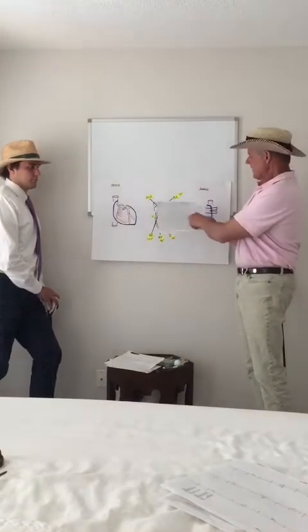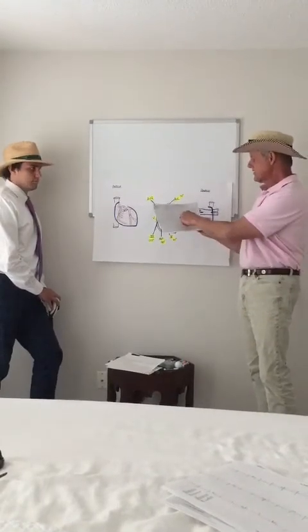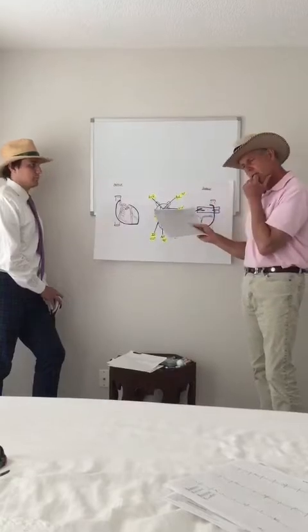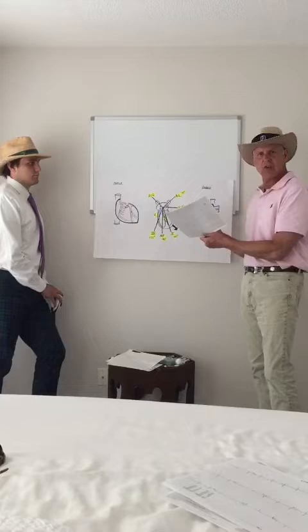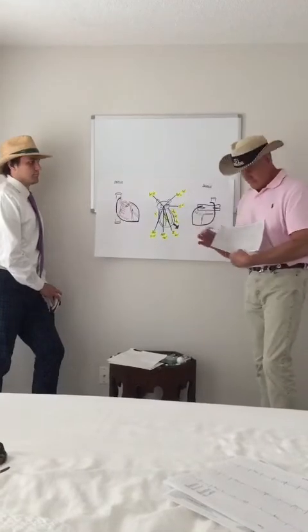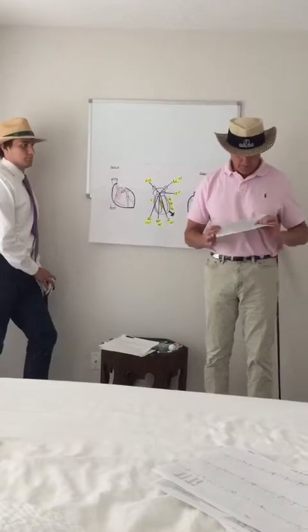And you look over here and you say, well, my goodness, we have some massive ST depression in lead V2 and even V3. What's going on? Well, that, my friends, is evidence of an acute posterior infarct. Now, the easy way to do that, you can memorize that. Everything's reversed in the posterior wall.